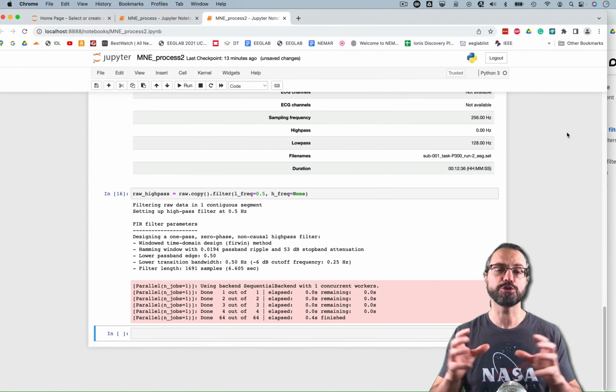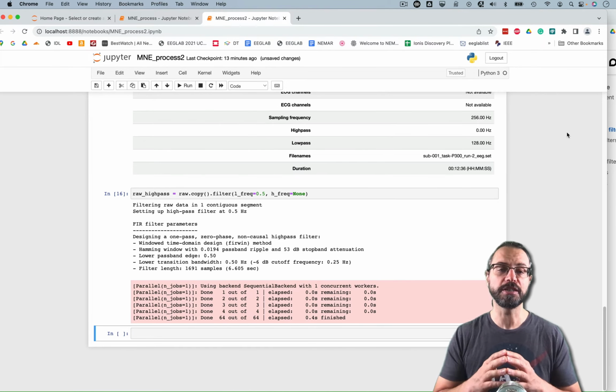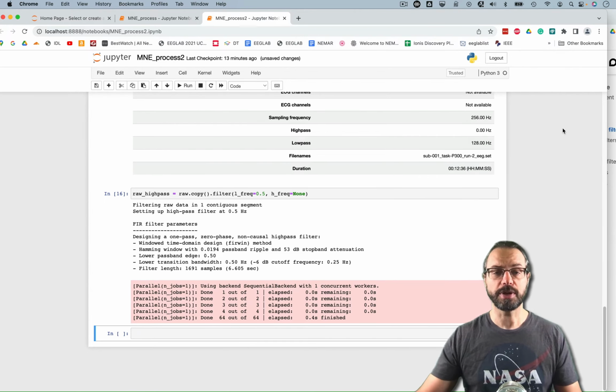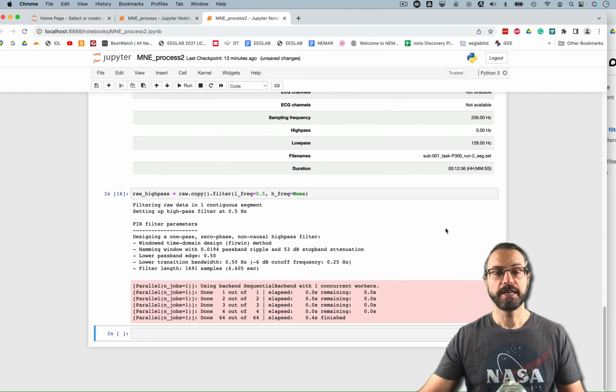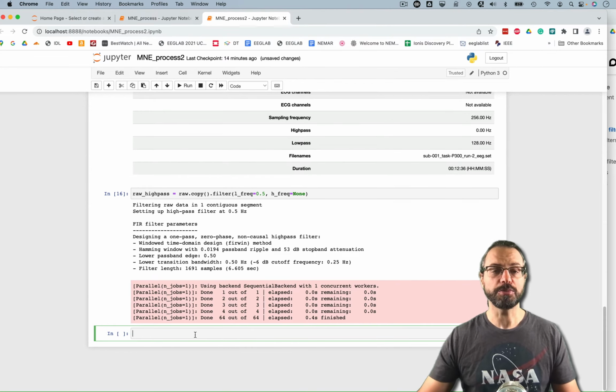So they're really close to the core. So I trust what he did. Also, I was in his PhD committee, so I read his paper, and most of his thesis was actually about one of these methods. So I'm going to use this method, Autoreject. First, because I'm relatively familiar with it. Second, because I think that's the only one to do automated rejection.